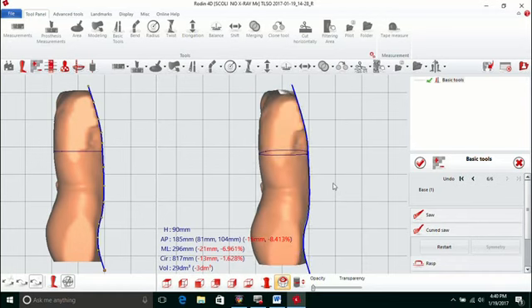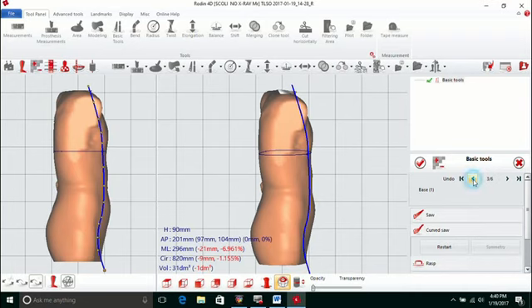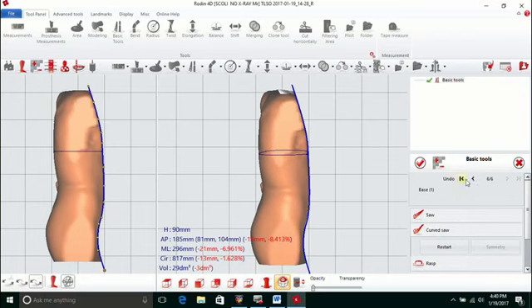If you're not satisfied with that or you want to change it, over here on the right hand side, you can see where it says 66. That's the number of clicks I've made using this tool. You can back up incrementally and return your cuts, or all the way back, you can turn it on and off.